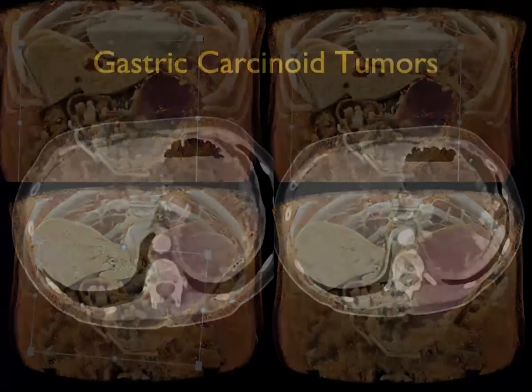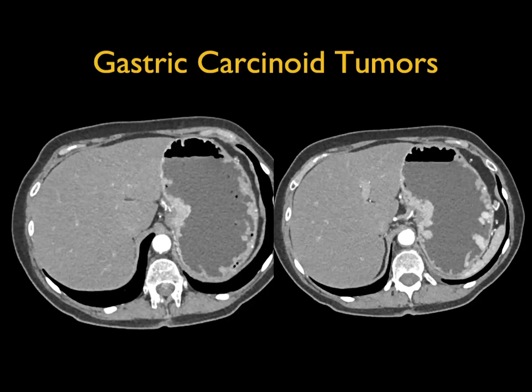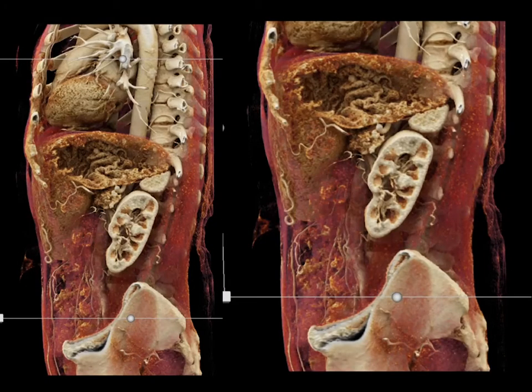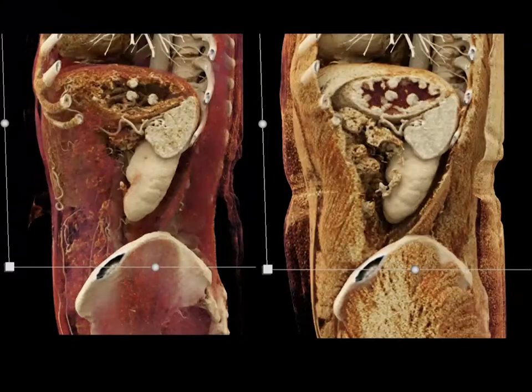was malignant. Or this example, we have a gastric carcinoid tumor, multiple large lobular masses representing folds, which are really nicely shown here with the thickened folds as we cut through the stomach, or in the sagittal view where the masses with the stomach representing gastric carcinoid tumors, are all very, very nicely shown.